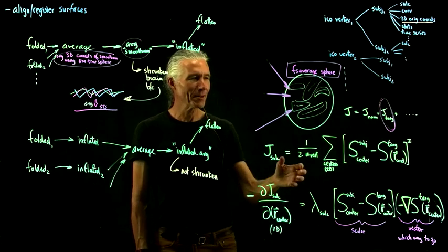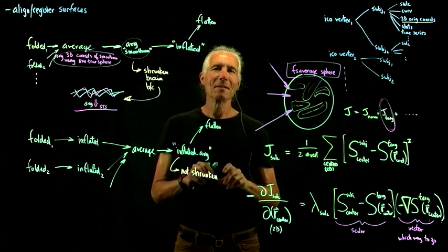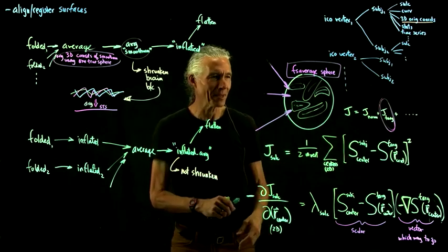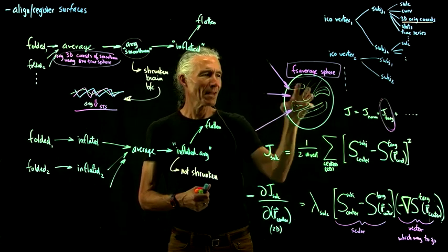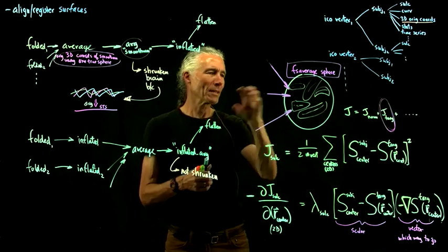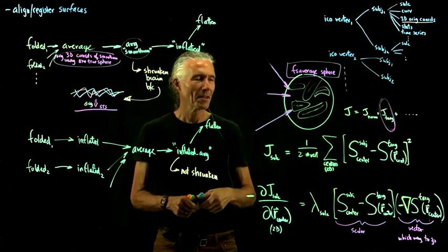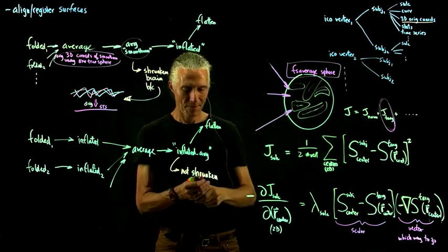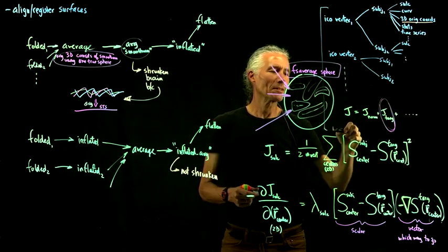So you don't have to do any of this. You can just type in recon-all, and all this will happen, and you'll end up with your surface that's aligned to the sphere, so that you can then do statistics, sample data onto the FS average surface, and calculate statistics on these lists, et cetera, down to 160K.